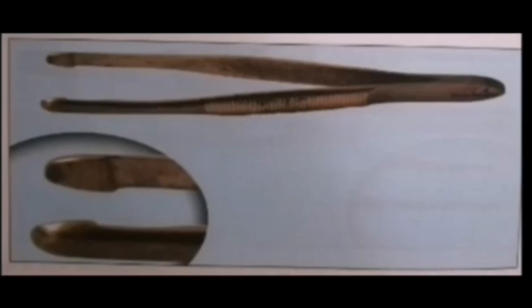Let's move toward the next one. And here it is. It is known as epilation forceps. It has blunt and flat ends. You can see very clearly here. And it epilates the cilia in trichiasis and stye.